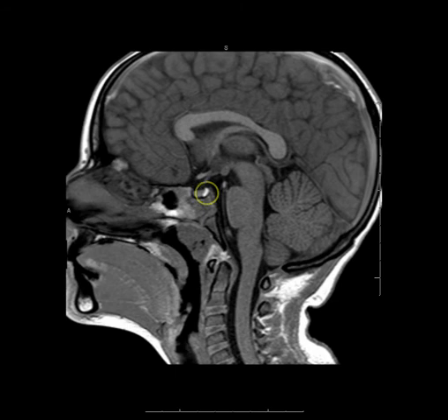Sometimes you'll have to struggle a little bit to distinguish the bone marrow signal of the dorsum sella from the posterior pituitary gland, but this one is pretty clearly the neurohypophysis. The adenohypophysis has, at least on T1 weighted images, signal intensity similar to that of gray matter. Some skull-based anatomy that's important to be aware of. The foramen magnum, which is Latin for big hole, is at the bottom of the skull, and the anterior border of which is called the basion, and the posterior border of which is called the opisthion.